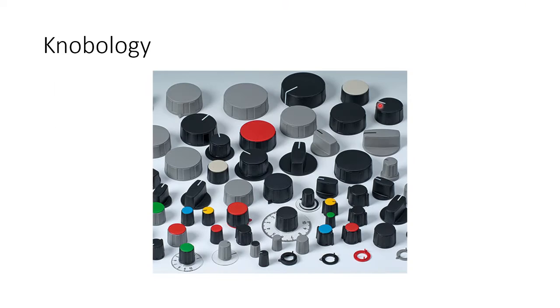The terminology Knobology was used for echocardiography mainly because in the earlier echo machines there were big knobs used to control and change various functions. Initially it looked very confusing to the beginner as to what these knobs do, what will happen if you turn it on or increase it or decrease it. So knowing the functions of each and every knob is the topic for today.